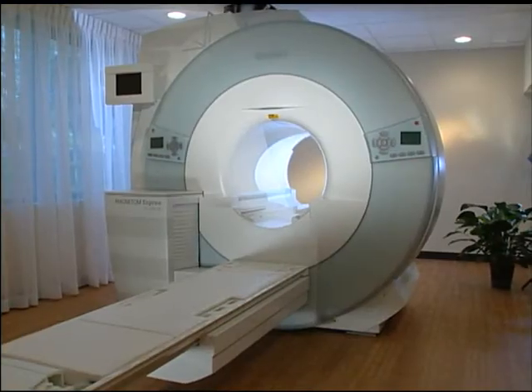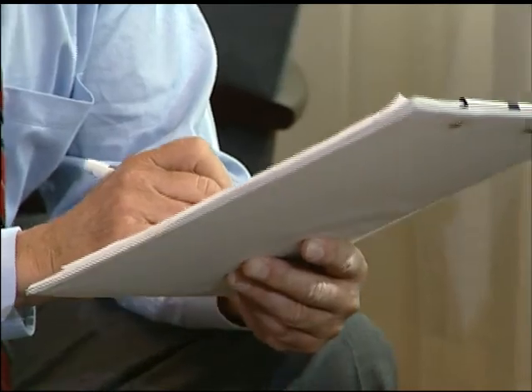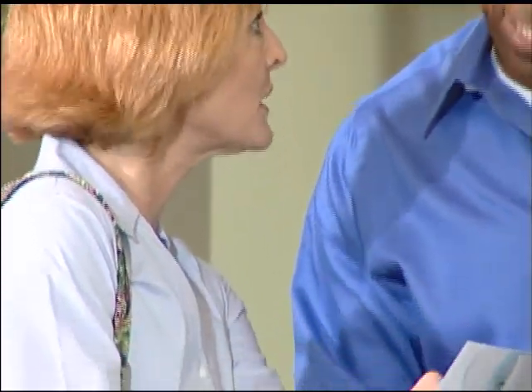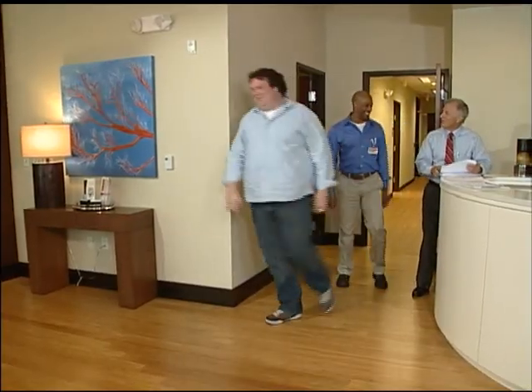the results with you. Hopefully, spending these few minutes learning about magnetic resonance imaging has prepared you for your examination. However, should you have any questions, your physician or the imaging professionals at the MRI facility will be happy to answer them for you. So relax and have a good exam.